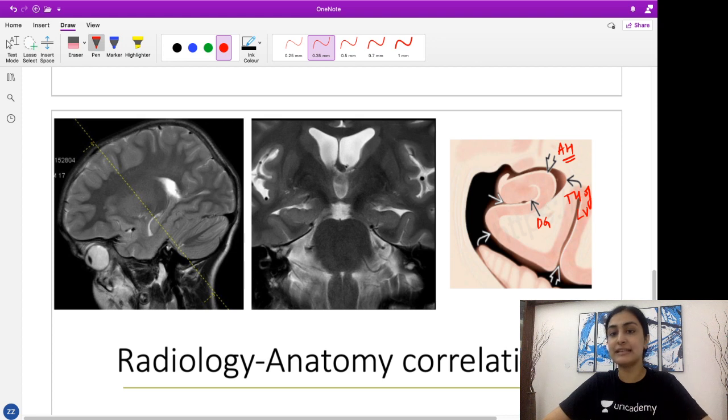You'll understand the significance of the temporal horn once we look at the pathology. The temporal horn dilatation, remember, becomes a very important feature when we want to look at the atrophy of this area. If this is normal, we should have only this much of temporal horn. If this were to undergo atrophy because of the sclerosis, which is the pathology, the temporal horn would become widened. That is one of the very useful features that we use for imaging of MTS.